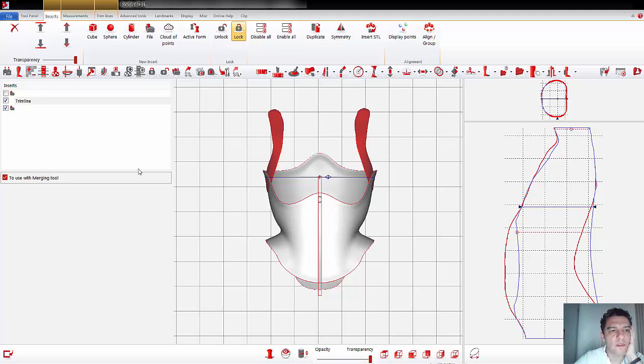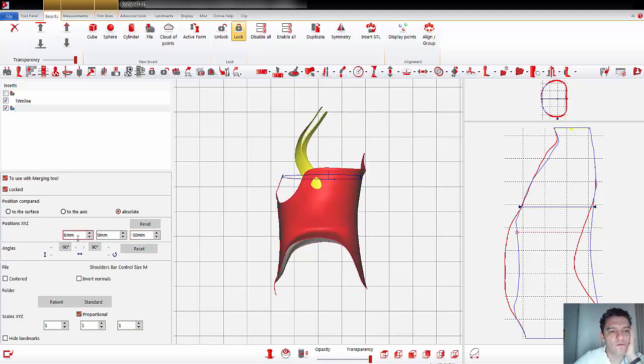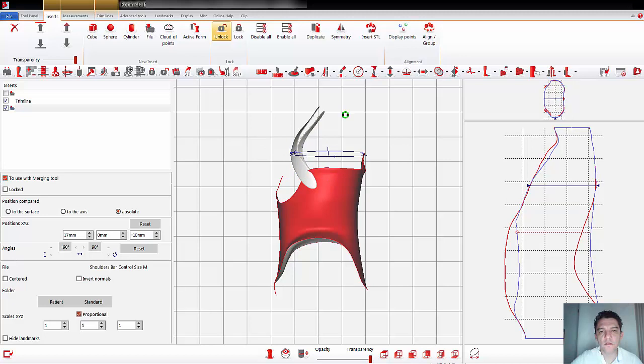Okay, and after, let me move more anterior, or you can, if you want, don't forget that you can activate it, and in this case, probably if we put 0.05 should be great.